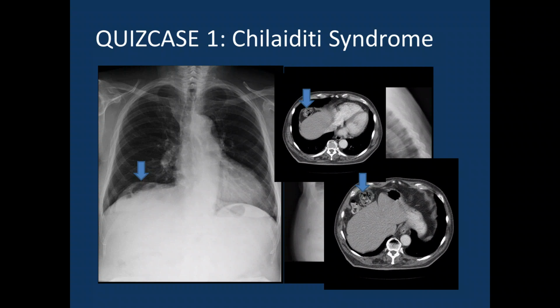And then Mr. Holzknecht did a lot of things. I don't like to know what he tried to find out what it is, but this is the famous interposition of colon between liver and diaphragm. And Holzknecht helped Mr. Chilaiditi to make the case report, but he was the first author, and so it's the Chilaiditi syndrome, and he's much more famous than his teacher. I like this case because Mr. Chilaiditi had one paper in the world, and everyone knows. But it's an important syndrome.